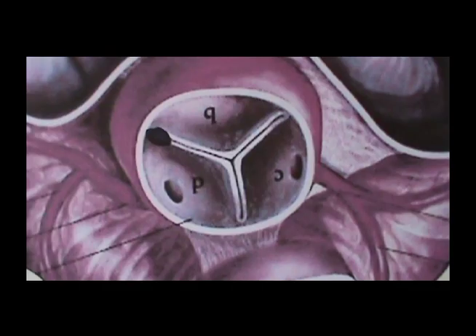When activated, continuous wave Doppler is a one-dimensional function. In this valve graphic, the red laser dot represents the continuous wave Doppler interrogating the valve. Continuous wave Doppler would probably reveal a large valvular lesion with no difficulty. However, the cursor must be directly on a small lesion to reveal a flow disturbance. The black area represents a small localized lesion.